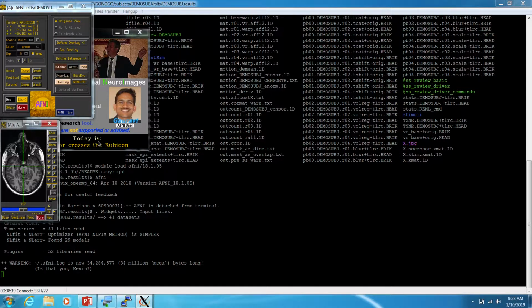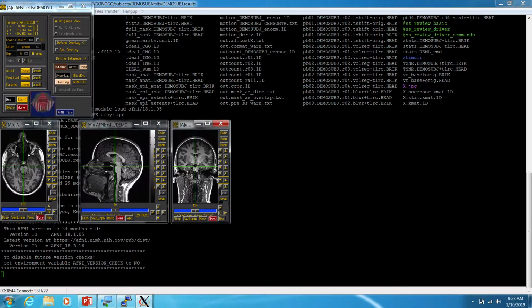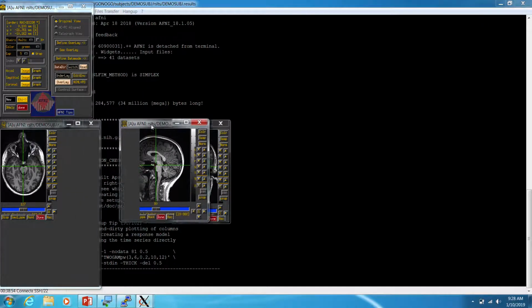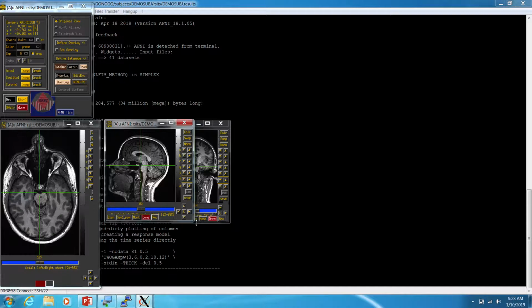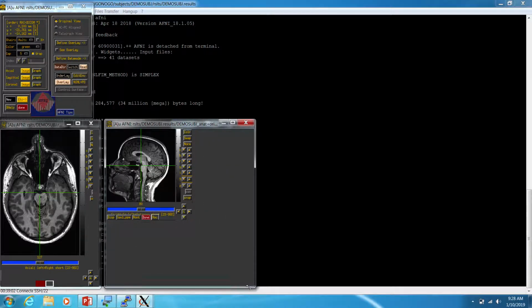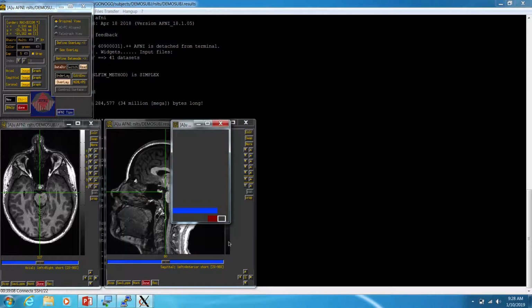Okay, so this is our AFNI interface, and a session or two ago I showed you guys just a little bit of this. But what the program ends up doing, I'm going to make these a touch bigger, is it looks in whatever the current directory is, and it searches through, and what it's trying to do is find an image file, because it wants to try and make your job easier.